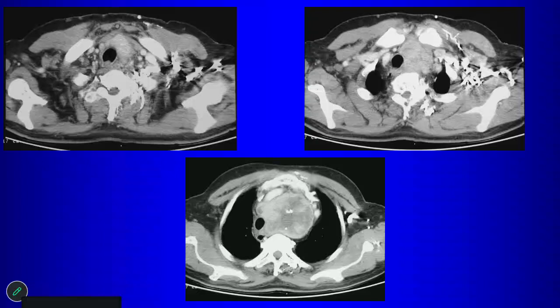In terms of deciding whether this is benign or malignant, whenever you have large masses like this, you can never be 100% certain. But the features here that point to this being benign are what? What's that? So the vessels are pushed away, right? And you see that there's a very nice boundary between the mass and the surrounding structures, okay? So there's no overt signs of invasion as you're looking at the CT.